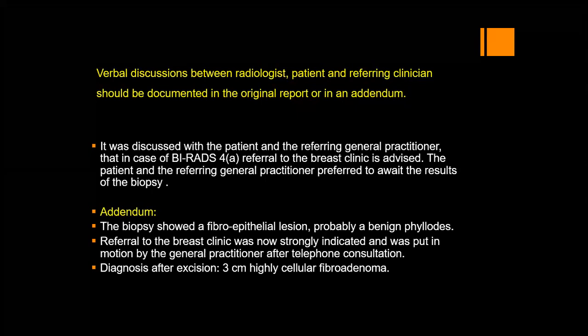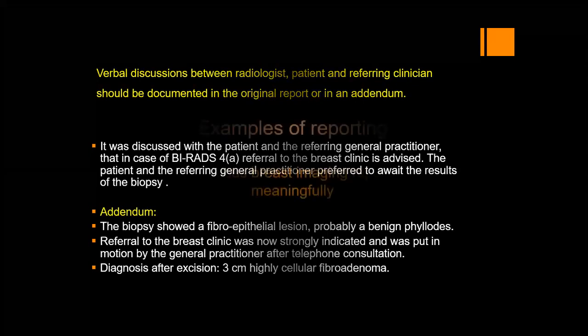We mentioned those. Fibroepithelial lesions are fibroadenomas and phyllodes tumor. Referral to the breast clinic was now strongly indicated and was put in motion by the general practitioner after telephone consultation. Diagnosis after excision: 3 centimeter highly cellular fibroadenoma. This is an example.